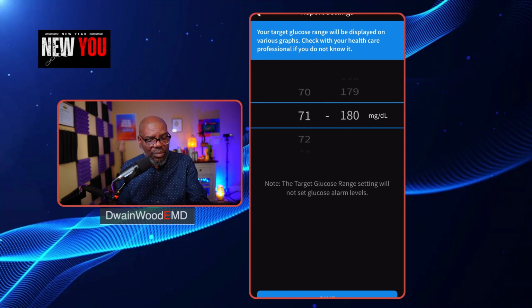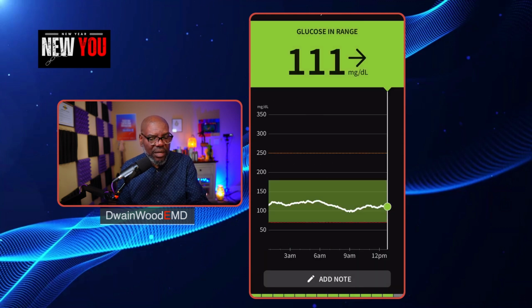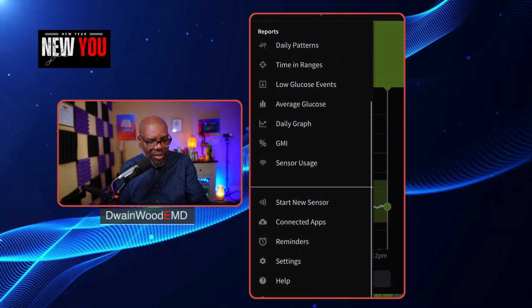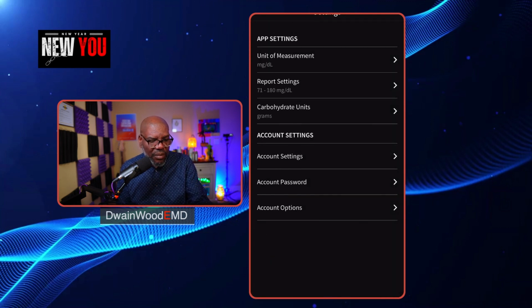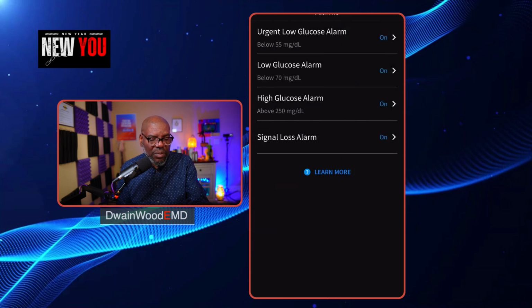Boom, boom, boom. Okay, we're going to save that, and then now back here. All right, so that's the things that we can do there. We can also set an alarm. Notice our alert, and let's go back under settings. Let's see, where are my alarms? There we go. Okay.